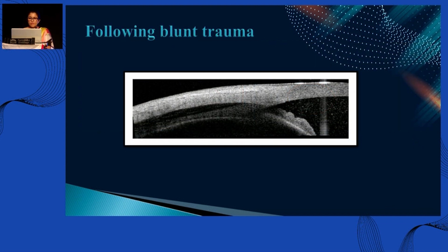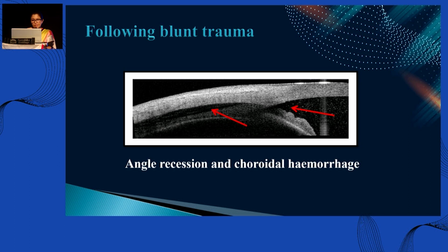ASOCT is a very useful tool in patients following trauma, particularly in the presence of hyphema, to assess the amount of damage. Here, the patient has angle recession and choroidal hemorrhage.